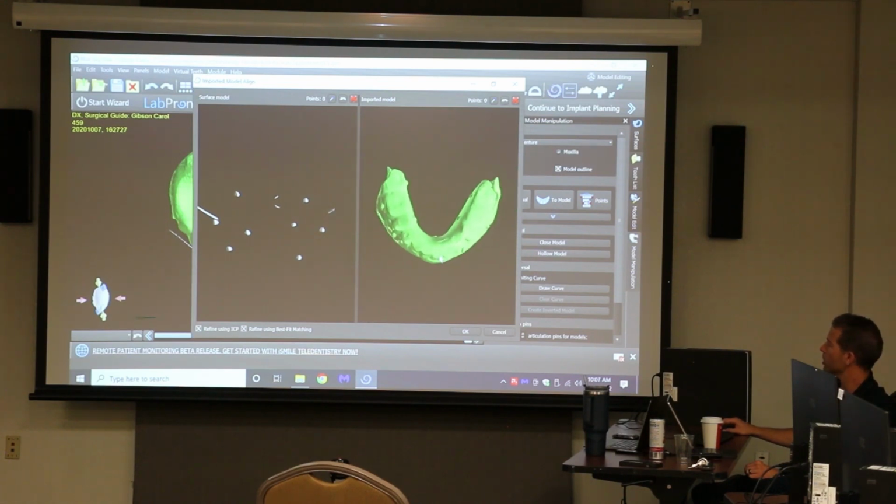So I'm going to look at this thing top down, and I can see 1, 2, 3, 4, 5, 6, 7, 8. And I can see 8. Now, this resolution is terrible. I'm having a hard time seeing on this big screen, but on your guys' smaller screens, it's going to be easier. But essentially, I'm going to go through, and I'm just going to click, shift-click my various points from the same view. So if you just go through here, and you're just clicking. But I'm looking at this from the same view, and I know what's what here.